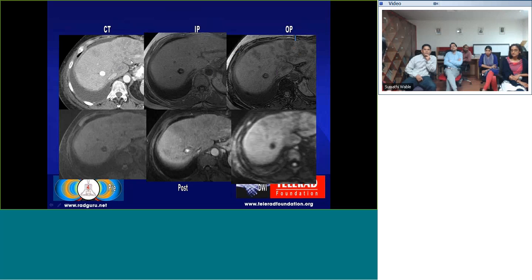Usually tumor displaces and distorts vessels, and that's something you want to keep in mind whenever you see something bizarre. Is it doing anything to the normal course of the vessels? So you can get periportal fibrosis, you can get periportal fat infiltration, diseased liver. So this was just periportal fat infiltration.